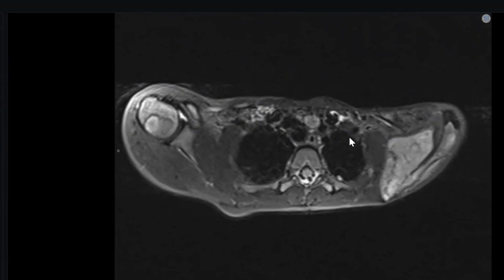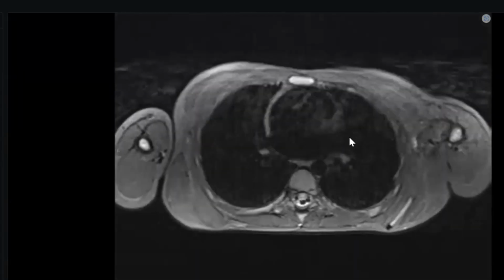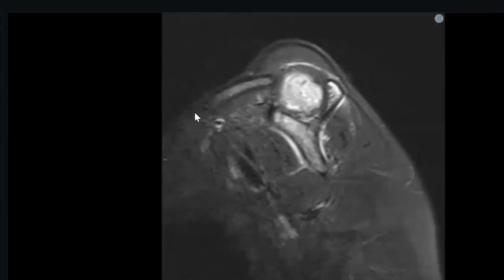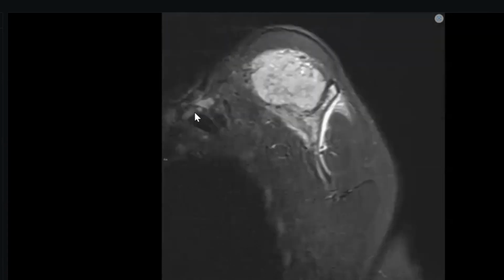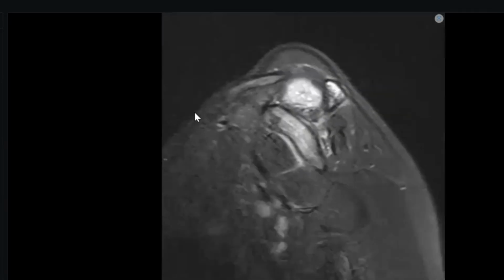What happened here? Large soft tissue mass at the subscapular region involving the muscle and causing bone destruction, infiltrating the adjacent soft tissues. Affecting which area? Supra-scapular muscle or region? See? Completely suprascapular. So what's your differential diagnosis or the diagnosis?